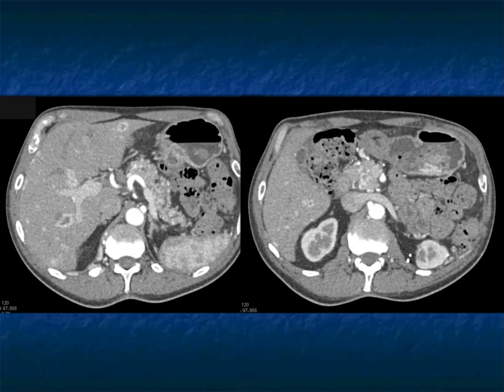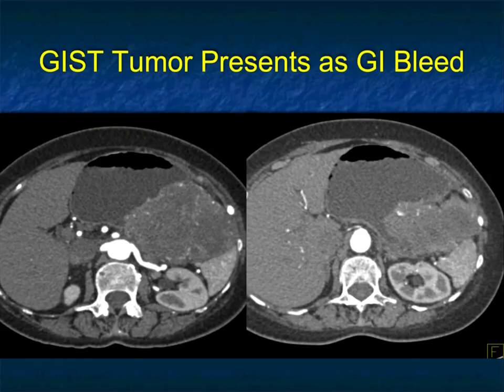Has the look of what appears to be a mass. There are also liver lesions present with some peripheral enhancement. You also can see on the image on the left, there's a partial nephrectomy of the left kidney. There's also a vascular lesion in the head of the pancreas. So now I'm saying clear cell renal cell carcinoma with liver metastasis, as well as pancreatic metastasis, as well as metastasis to the stomach. Wonderful case.